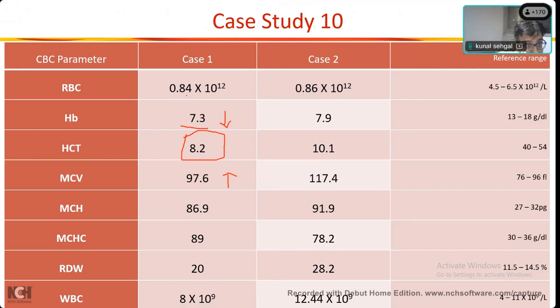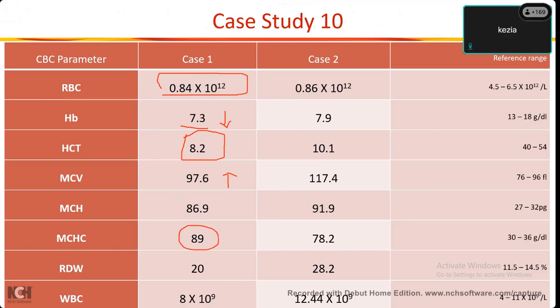Look at the RBC count. That also has a rule of 3, generally. Approximately, there is a mismatch there also. Very low RBC count, very low hematocrit, abnormally high MCHC. This is not viable. This can never happen. This high MCHC can never happen. So now, anyone?